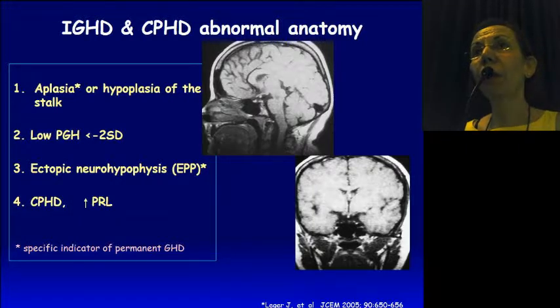What are the components? A small pituitary gland, a small adenohypophysis, orthotopic in the sella turcica, lack of orthotopic neurohypophysis, lack of neurohypophysis in the sella turcica, lack of visible pituitary stalk, okay, and an ectopic neurohypophysis at the level of the tuber cinereum.